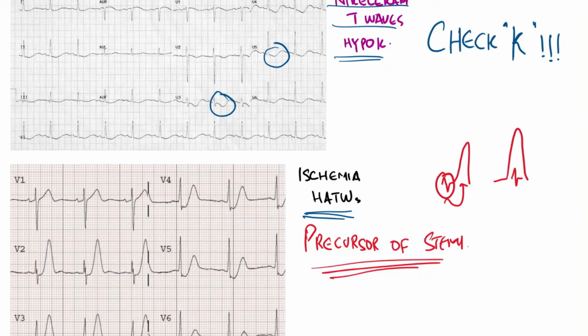There are also different cutoffs where you can calculate the T by QRS ratio, which is used to differentiate between a normal ECG versus a precursor STEMI, or an old MI versus left ventricular aneurysm. There are different cutoffs. It's more than 1.5 for this one. And to detect an LV aneurysm, it's more than 0.36. So if it's more than 0.36, it's an MI.